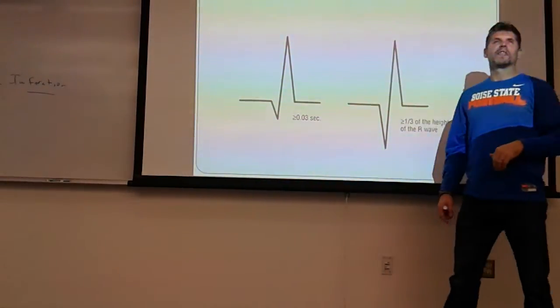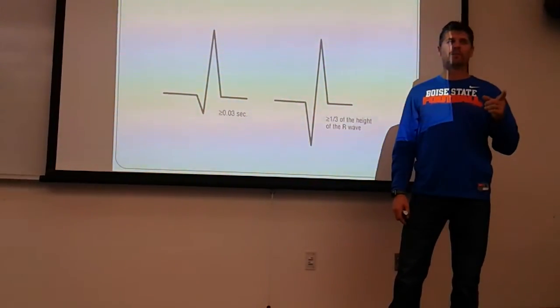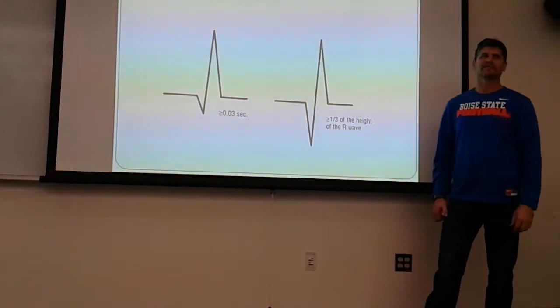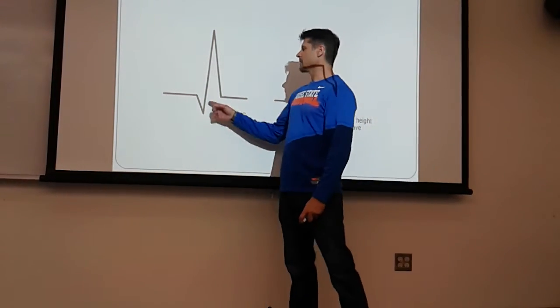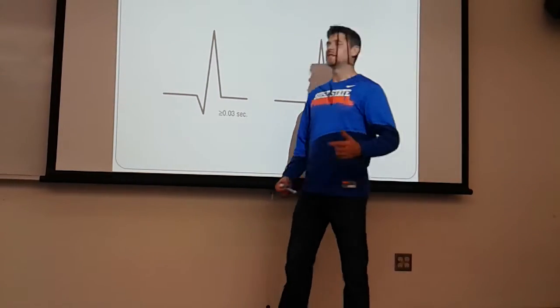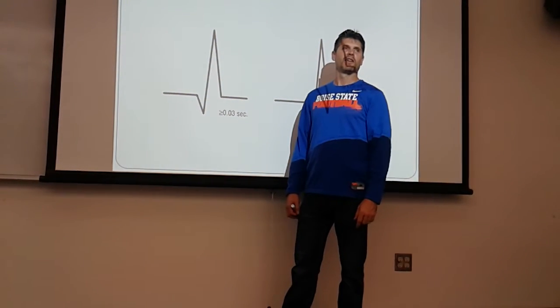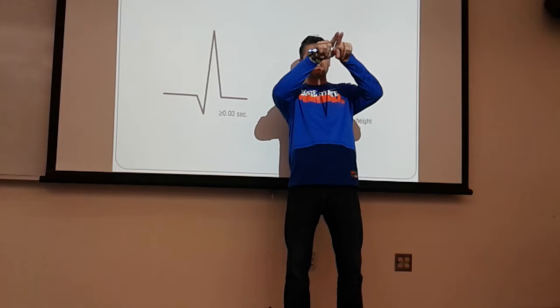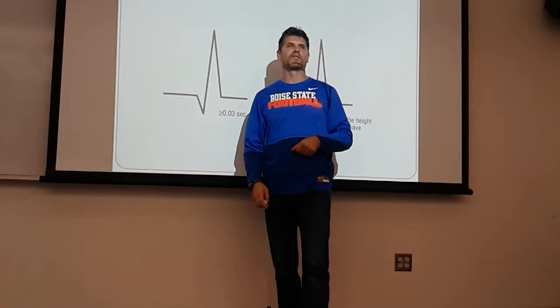And the thing is that you inherently might have some disruption in the EKG that makes it difficult to find when that happens, but you'd still be able to see the time and you'd still be able to see the depth pretty easily. It becomes easier to see those pathologic Q waves. And really, when you're looking at the Q wave, if you see daylight inside the Q wave, it tends to mean that it's significant. The ink usually runs it together where you don't see much more than just a crack at the top between the two. So when you see that widen out, you start, oh, okay, let's measure this Q wave.